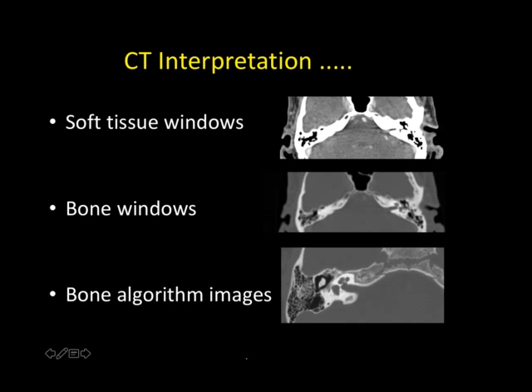Apart from this, bone algorithm is also important in the temporal bone and the internal auditory canal assessment. So that's another area where you need bone algorithm.